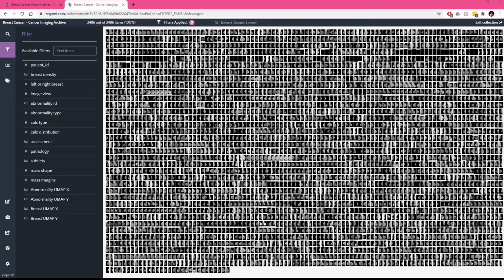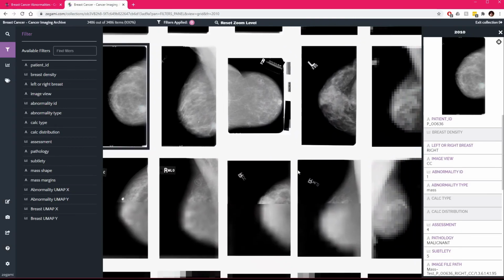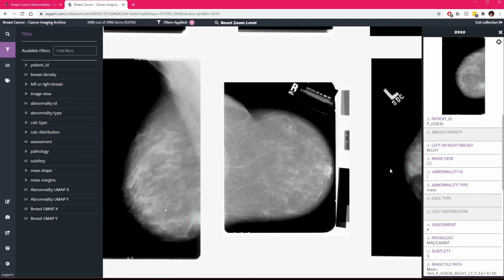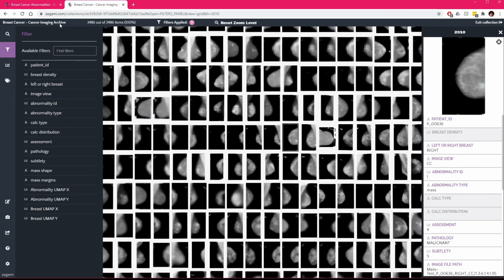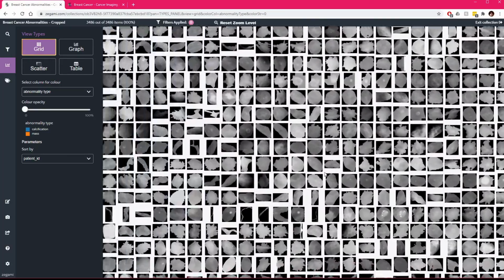Today I'm going to be walking through our breast cancer imaging collections, which show abnormalities in breast tissue mammograms. We have two different collections of this data, one showing the full mammography shots, as you can see here, with these regions here indicating where the abnormalities are on these full shots, and one collection showing close-ups of the abnormality regions, so those actual cut-out regions.